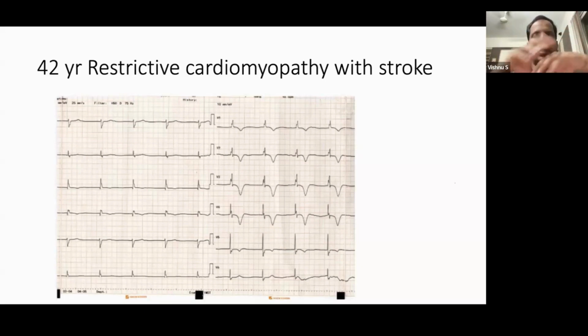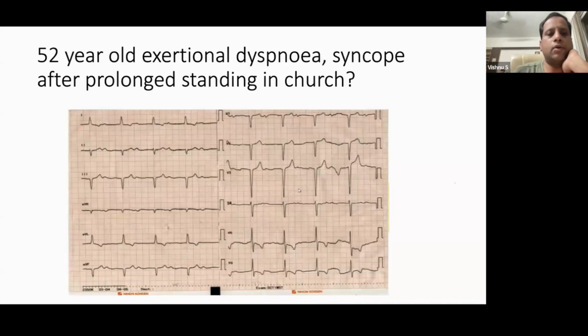Now atrial standstill. Till here, these blocks can happen in the atria, at the SA nodal level, atrial level, AV nodal and junctional. AV nodal blocks are mainly due to vagotonia usually and drug effect. Now from here, we will go to the AV nodal level.